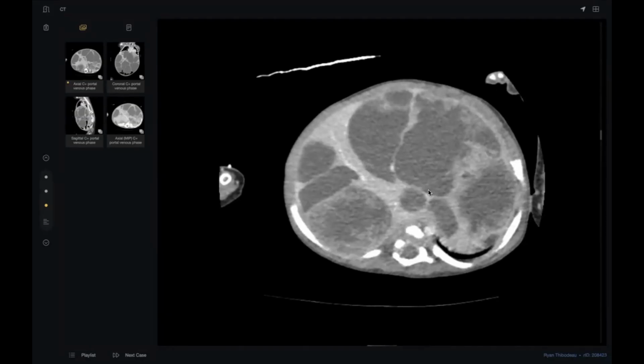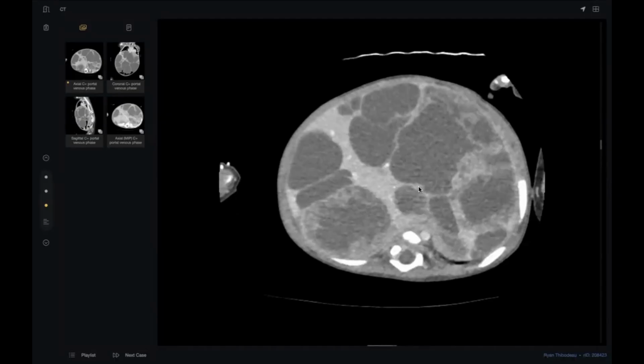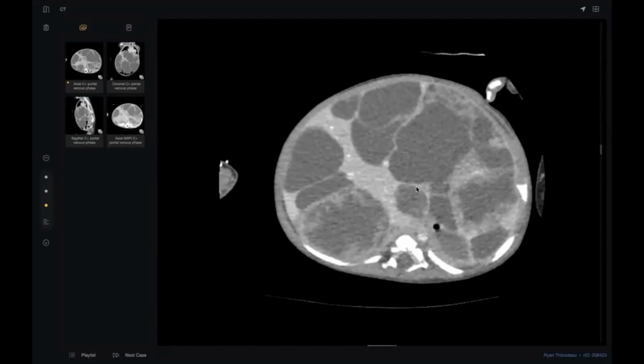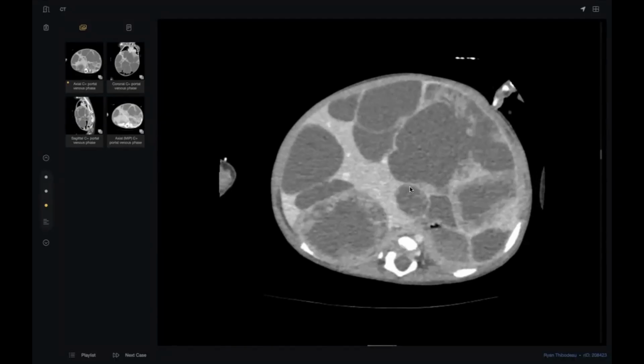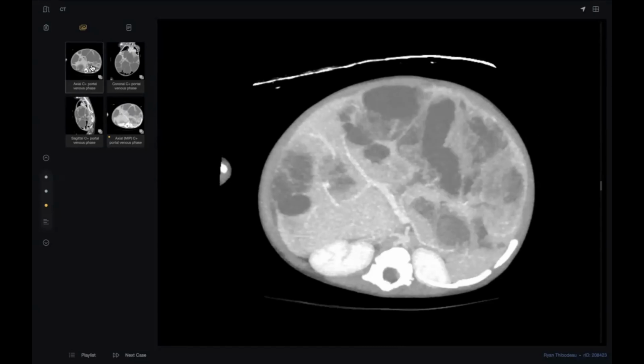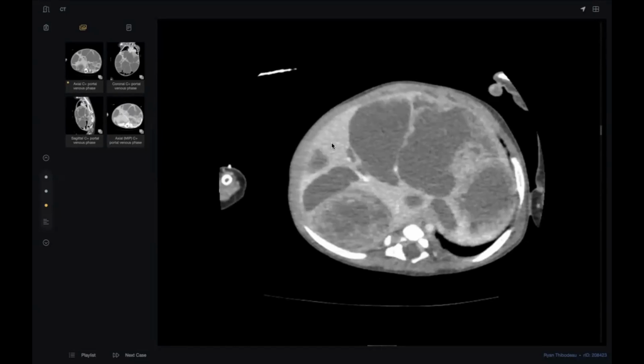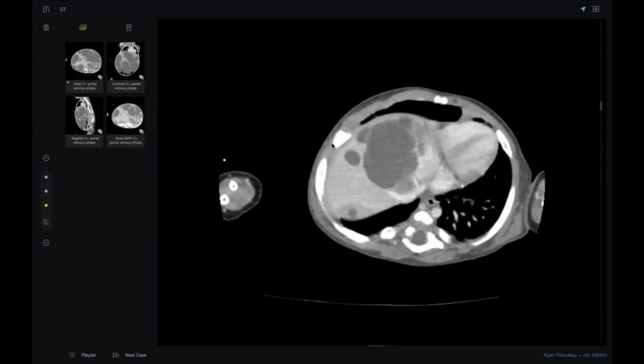Hemangioblastoma or hemangioendothelioma. Hemangioendothelioma or hepatoblastoma? Hepatic hemangioendothelioma. And hepatic hemangio, look here. See, this is the venous. Okay, no, this is middle. Okay. See? Okay.